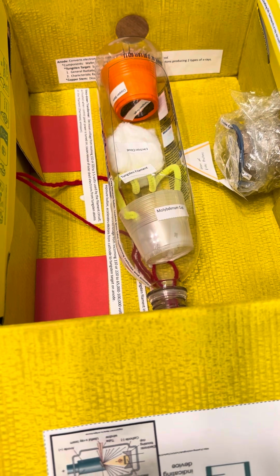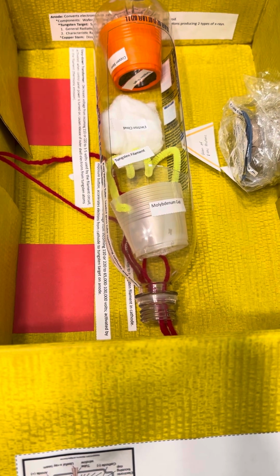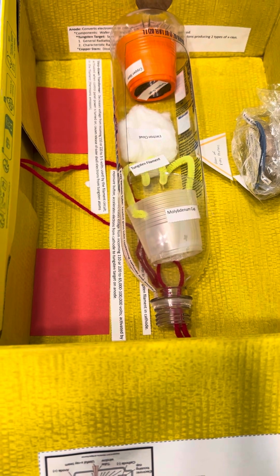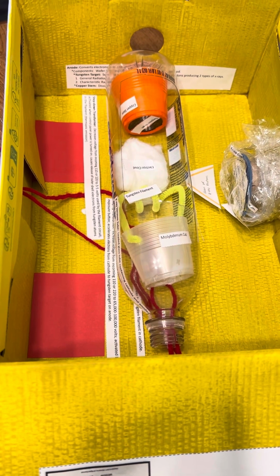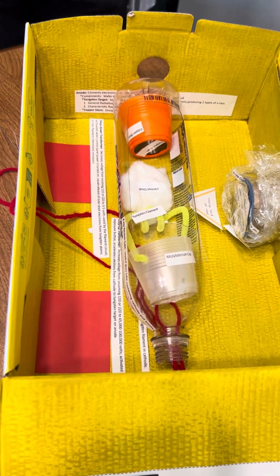We also have the tungsten filament, which produces the electrons when it's heated. We also have the molybdenum cup, which focuses the electrons into a narrow beam towards the tungsten target. As you increase or decrease mA, the number of electrons passing through the tungsten filament creates quantity, and kVp increases or decreases the speed or force of electrons sent from the cathode to the anode.